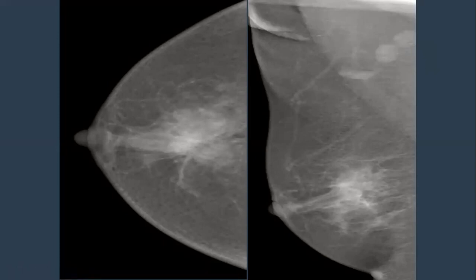Okay, this is a limited evaluation. It needs to be visualized by ultrasound to confirm more suspicious features. But here, at least, this is globular rather than oval, getting more globular, and there is a subtle area of perinodal edema, raising suspicion for a metastatic node, to be clarified and characterized further by ultrasound.